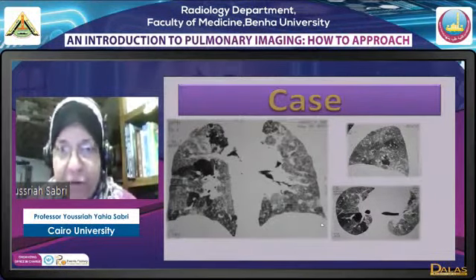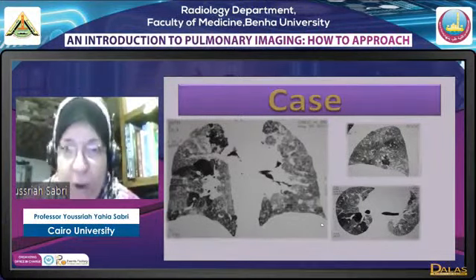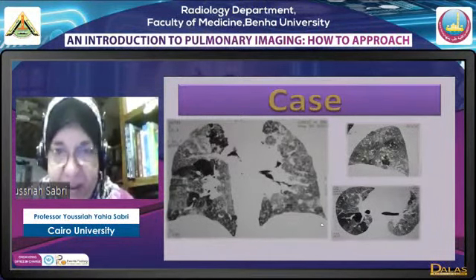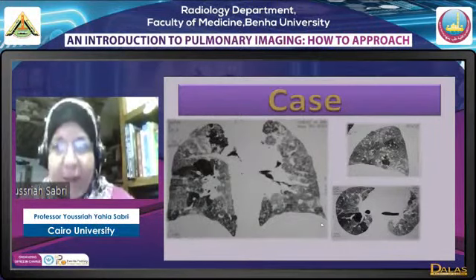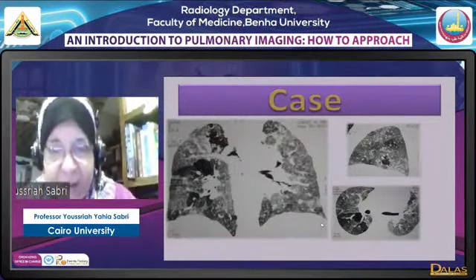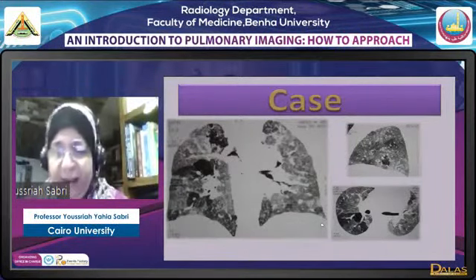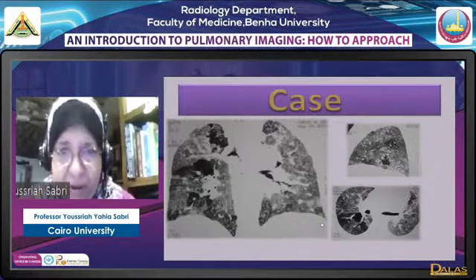But in high resolution CT, there is a pathognomonic appearance. This is the pathognomonic appearance of subacute hypersensitivity pneumonitis. What is subacute hypersensitivity pneumonitis? Well, it is considered an interstitial disease. It may also be considered an organic pneumoconiosis.